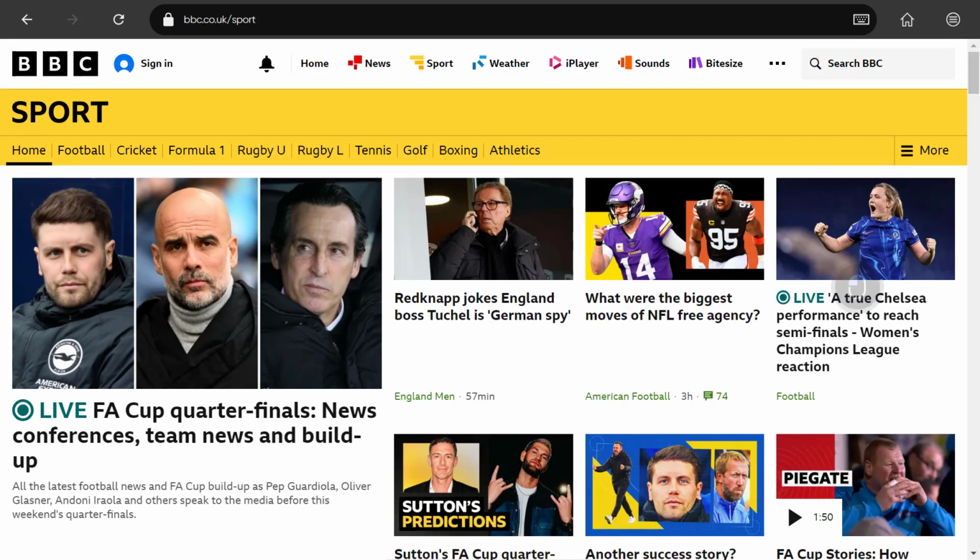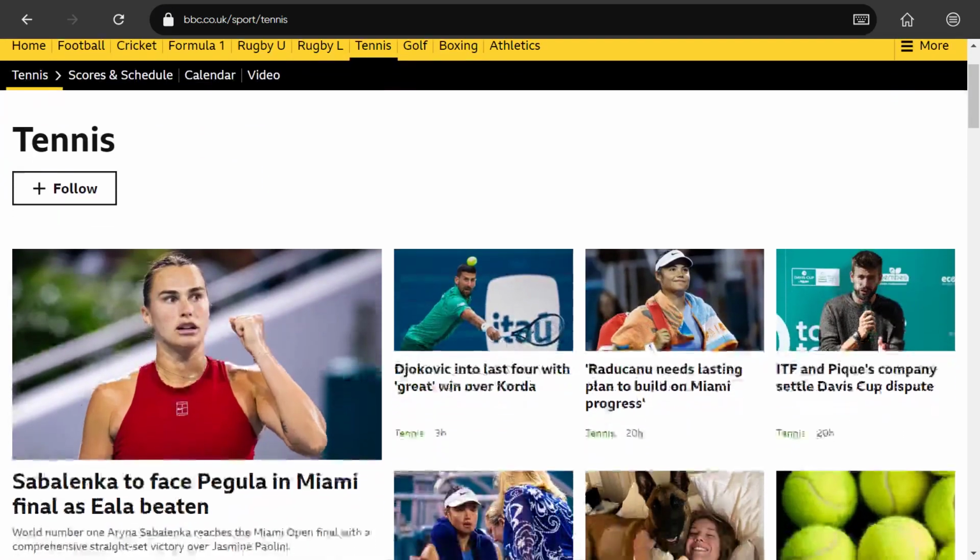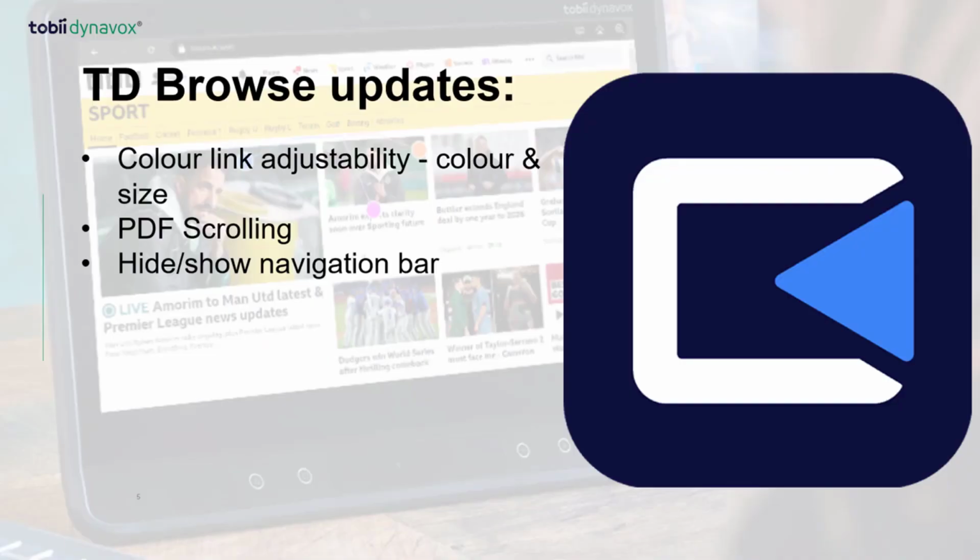With the simplest of interfaces, just choose between scroll or click mode, minimal learning is required for users to get going online. The April 2025 updates bring even more accessibility and functionality to this exceptionally enabling tool.